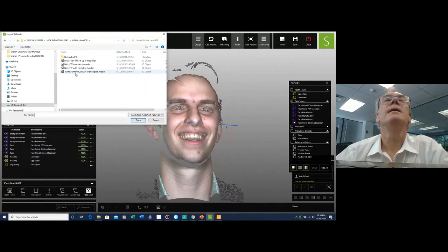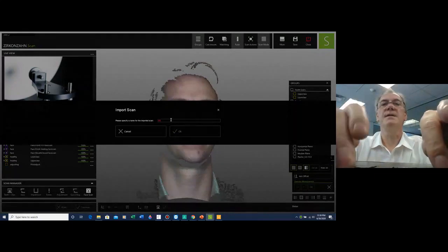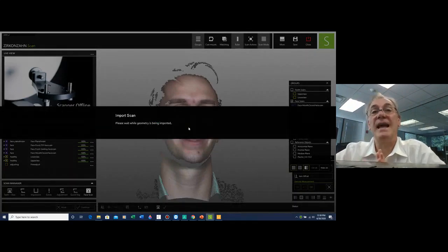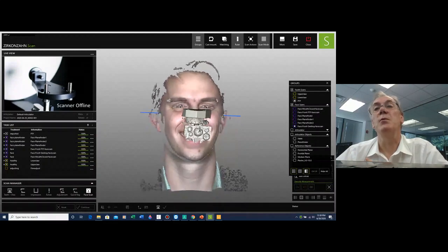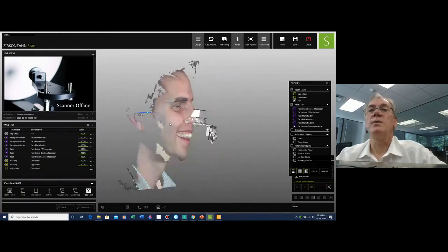And I'm bringing it in as the green fork with the model already in position. So this is my FTF, and we say, okay, an upper jaw, and it's going to load my FTF. I scanned the face transfer fork in my laboratory scanner, on my benchtop scanner, with the model already in position, already with the impression. So besides utilizing the anterior markers, I'm also going to verify that it matches and combines with the actual model directly on the impression that we are going to utilize.